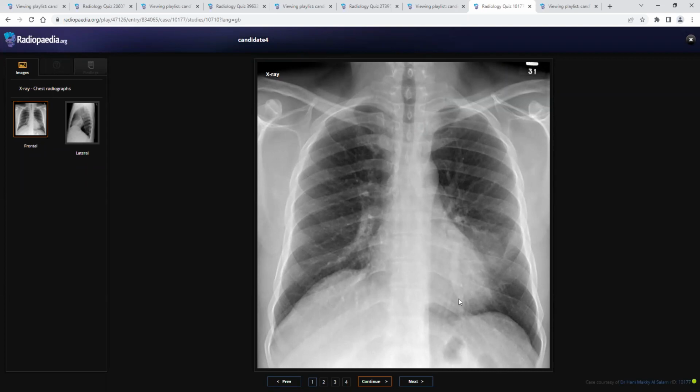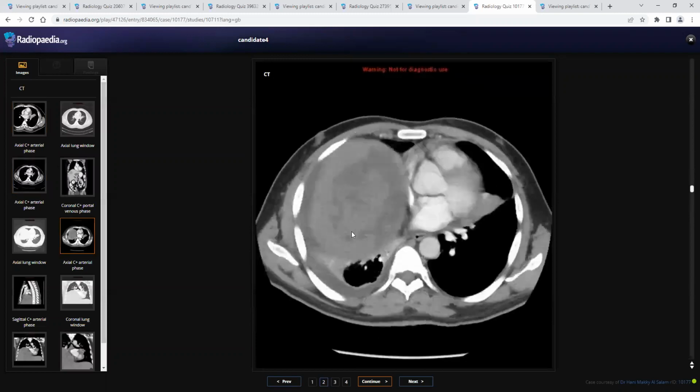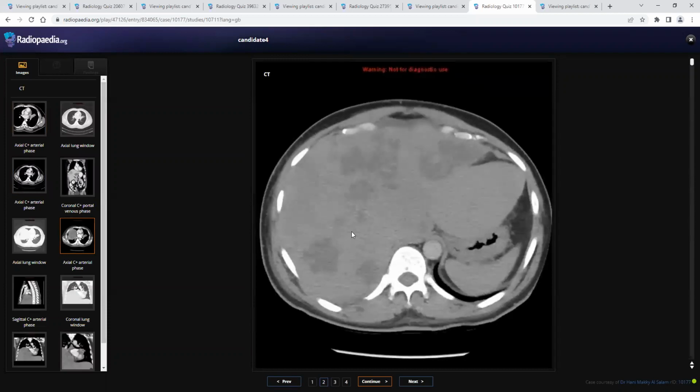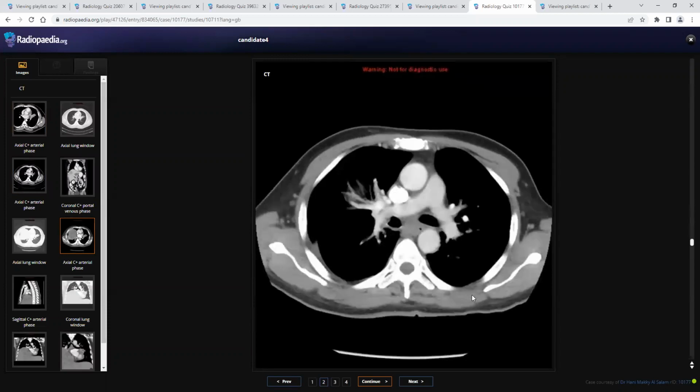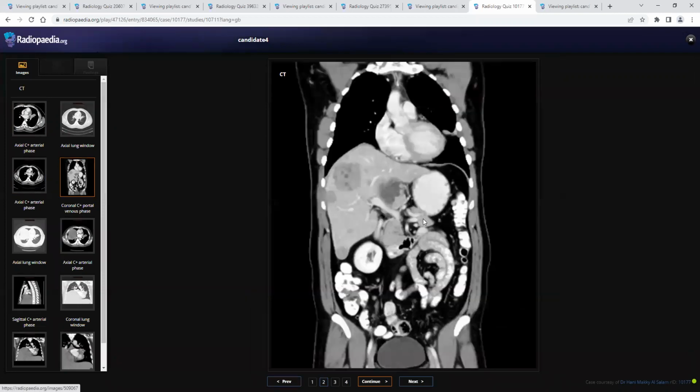This is a quite difficult case. This is a case of bronchial carcinoid, as you told. This is because it is a very young patient and a non-smoker, in the age of 20, with a patchy perihilar consolidation area, which was evaluated by CT chest, abdomen, and pelvis. As you see, this is a heterogeneously enhancing perihilar, basically peribronchial lesion with multiple metastases. It's very rare for a young patient to have a bronchial carcinoma and liver metastasis at this young age. So that raised the suspicion, and they evaluated in terms of carcinoid.